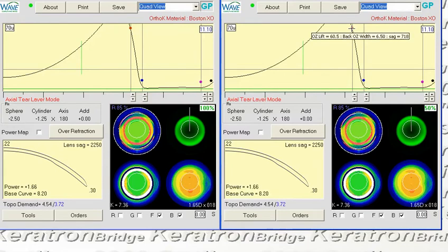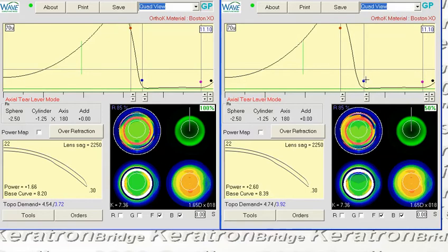And I'm going to bring this from 6.5 down to 5.9. Similarly, I'm going to bring the IC from 7.1 to 6.5. I'm only changing the size of the zones. I'm not changing any vertical displacement of the control points at this point.